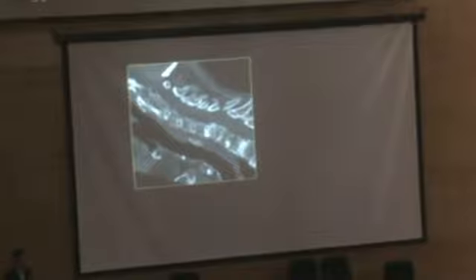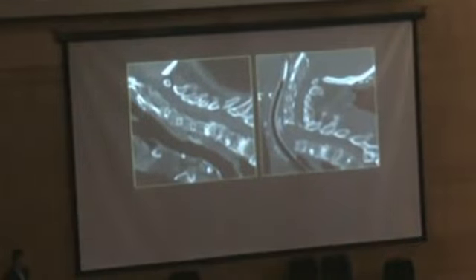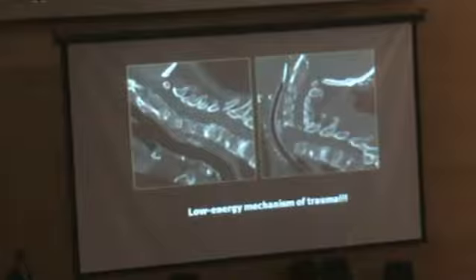And this is an example to show you again. This is a rigid spine, but it's a very fragile spine. It's really fragile. Huge osteopenia. This is a subject with ankylosing spondylitis. You can see here already something going on in the posterior element, probably a transdiscal fracture, and this subject was going to be intubated for emergency purposes. And unfortunately, that's what happened with the subject. So this is a very low energy mechanism of trauma. It's a simple hyperextension just to intubate the subject, but because he had ankylosing spondylitis, a very fragile spine, that's what happened, unfortunately.